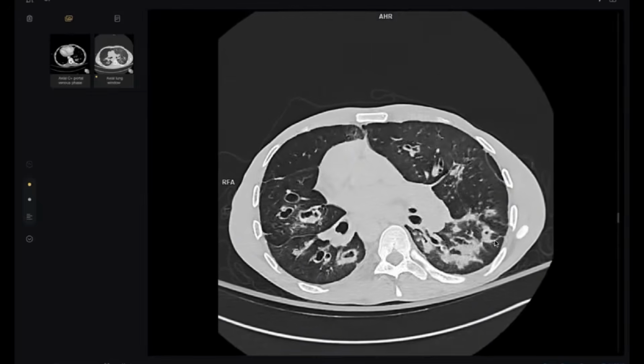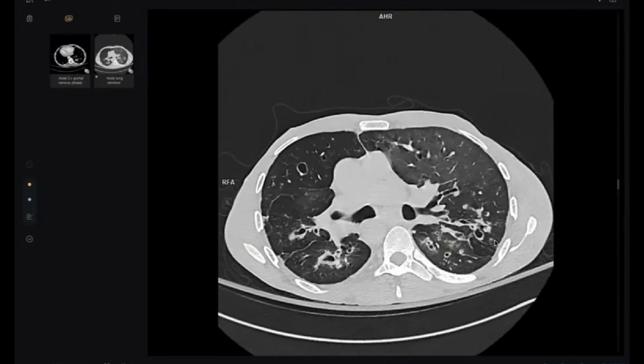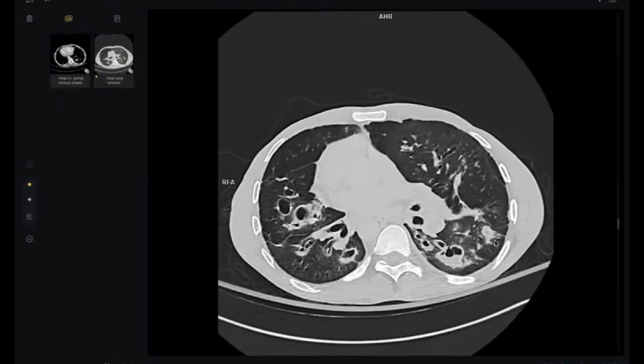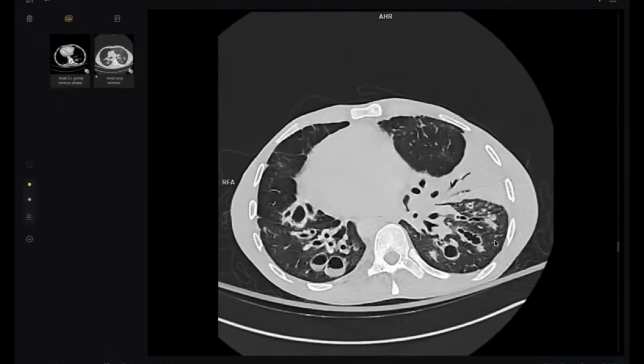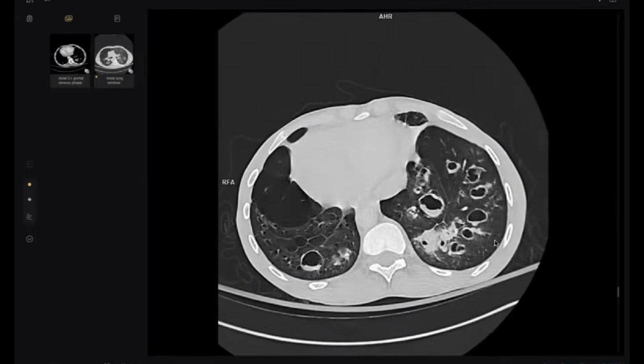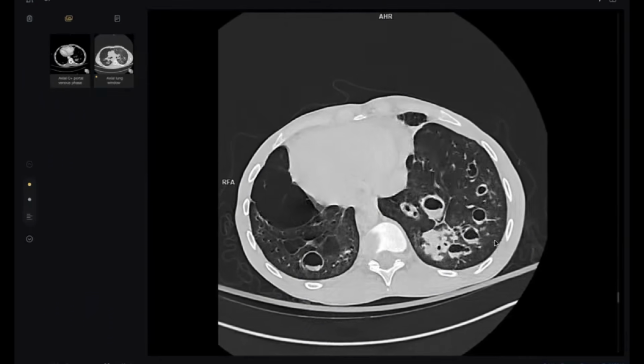Okay, so these bronchiectatic dilatations or changes of the bronchioles are thickened and forming cystic lesions. Can you please scroll down? So it's predominantly in the lower zone. Also, I see that the heart contour is on the other side, which says situs inversus.